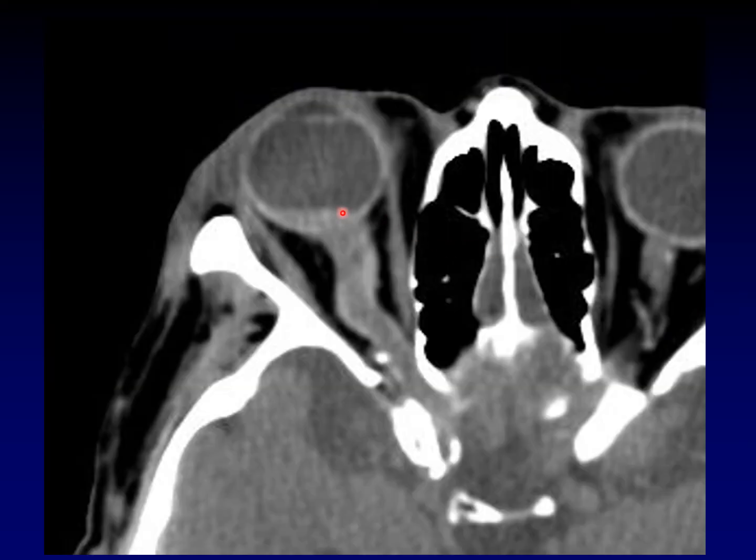There is one way to get subretinal hemorrhage that is not direct trauma to the eye. If you have subarachnoid hemorrhage in the intracranial vault, it can track along the CSF, along the optic nerve. Right? This is continuous white matter, that's continuous CSF, and so the subarachnoid hemorrhage can just track along. It can then track directly into the globe. It's poorly understood how it jumps into the globe, but you can get a subhyaloid hemorrhage as a result of hemorrhage along the optic nerve from the intracranial vault. This is called Terson syndrome.